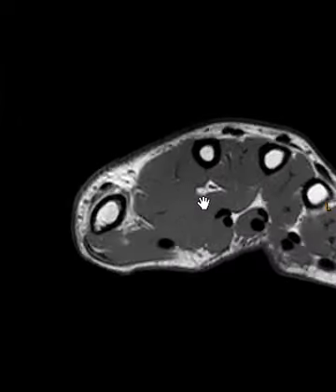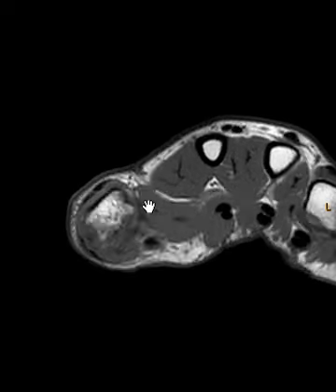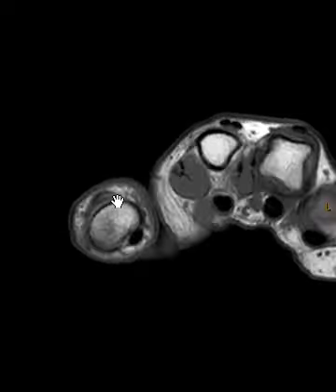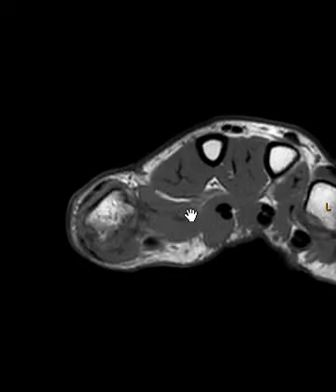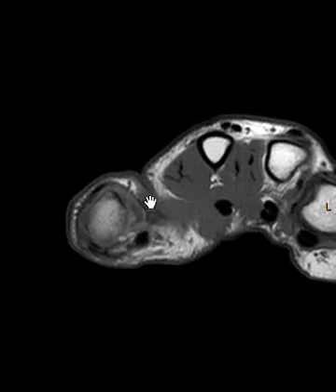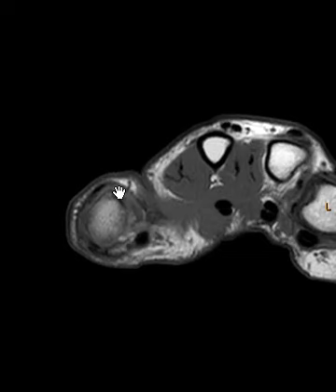So this is an axial view, T1 weighted image. In the deepest muscles here, we see one coming horizontally, close to the digits. This is the ADD, adductor. Adductor pollicis is going to come across sideways here, and it's going to give an aponeurosis that's going to go over the ulnar collateral ligament, which is about right here. So this linear band may be part of that aponeurosis, but just know that that's going to be in the front here on this view, more dorsal. The central tendon is hard to see because it comes obliquely and it's small, and it'll fan out and become an aponeurosis, the adductor aponeurosis, going over the top.